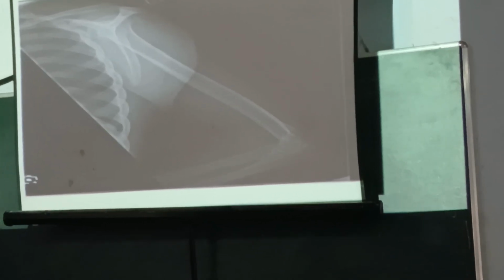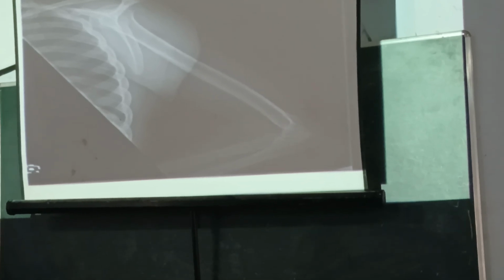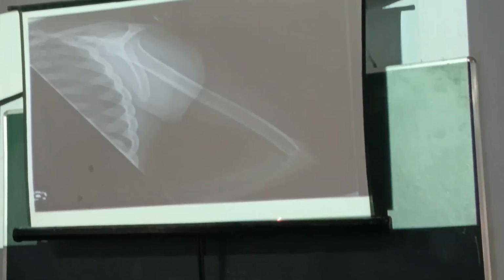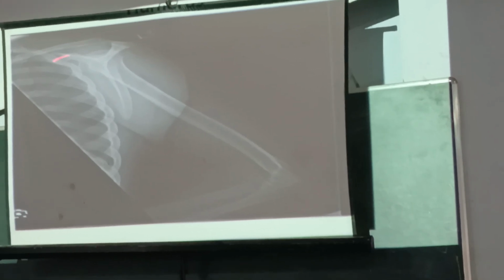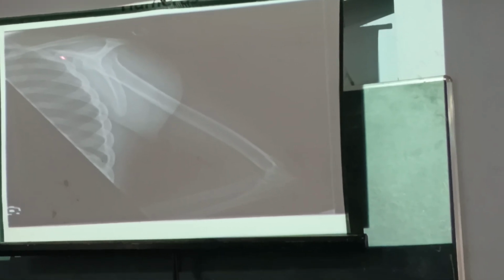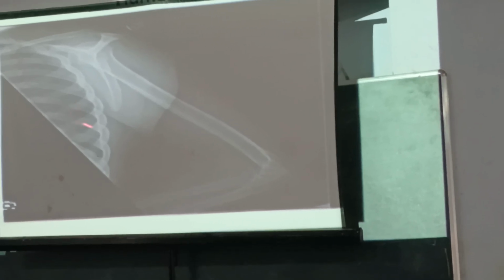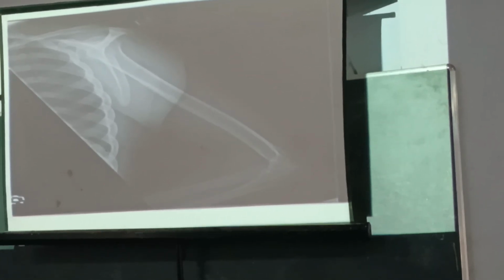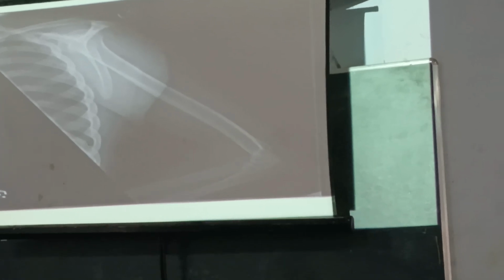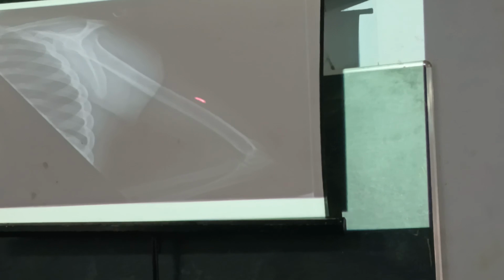We are least bothered about on which side the capitulum and trochlea are located. Whether there is a fracture or not, and the view, are the main concern. This is a lateral view of the humerus and you can't see the elevation of the deltoid tuberosity, because you are taking it in this manner. The deltoid tuberosity is located over here, not on the sides.